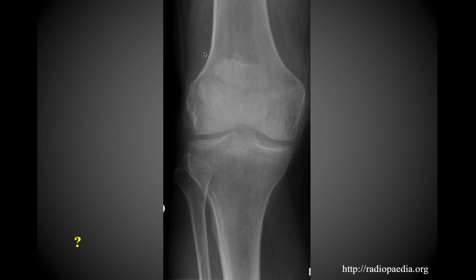This is another AP view of the knee. Again, you can see the medial aspect of the knee here and the lateral aspect over here. You can see the head of the fibula, shaft of the fibula, the intercondylar eminence, and then of course the tibial and femoral condyles. In this one, with the patella, you can see a hypodensity coming across the midpoint of it, which should raise a suspicion that something might be wrong with that patella.